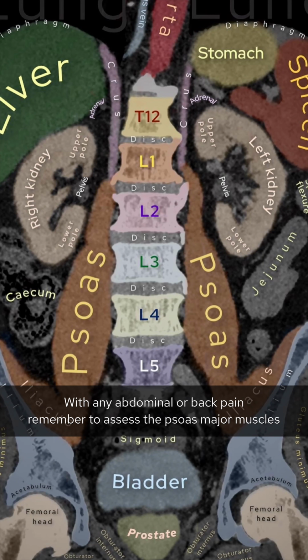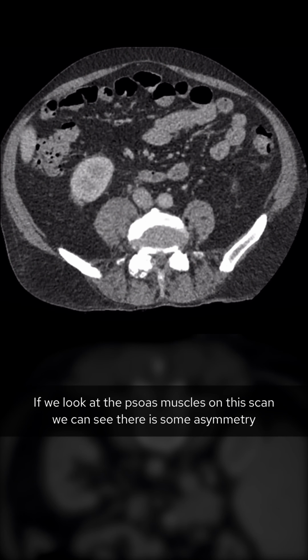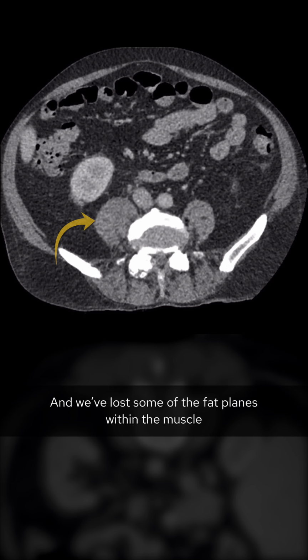With any abdominal or back pain, remember to assess the psoas major muscles, which originate from the T12 to L5 vertebrae and transverse processes before joining up with muscle fibers from the iliacus muscle and inserting into the lesser trochanter of the femur. If we look at the psoas muscles on this scan, we can see there is some asymmetry. The right psoas is larger than the left, and we've lost some of the fat planes within the muscle.